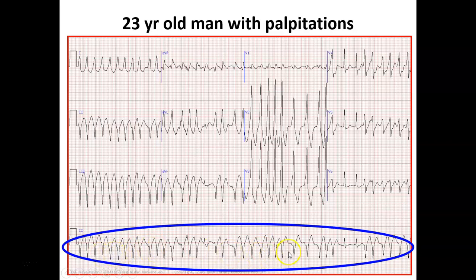it's the same shapes. So no P wave, but these are the wide complexes, and they are irregular. So maybe atrial fibrillation. Okay, and if you see the morphology, this is a right bundle branch block pattern.